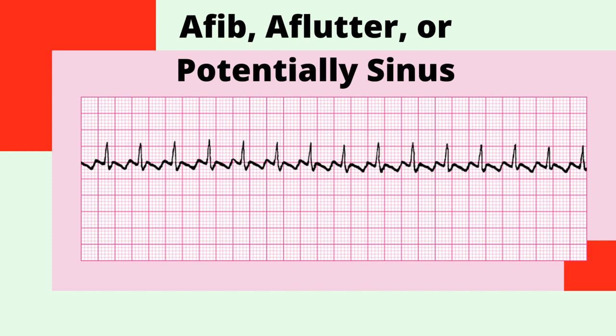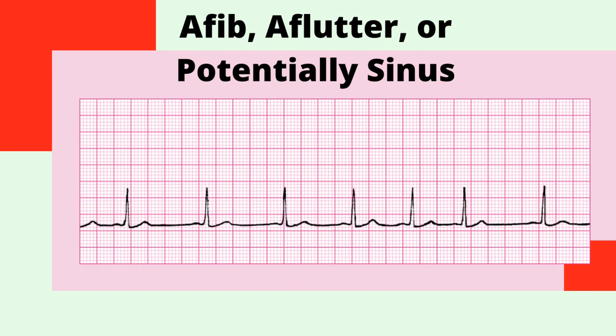And the answer is A flutter. So again, you can see those very distinct flutter waves. They have just such a unique shape to them. You should be able to identify them right away. Answer coming up, potentially sinus.